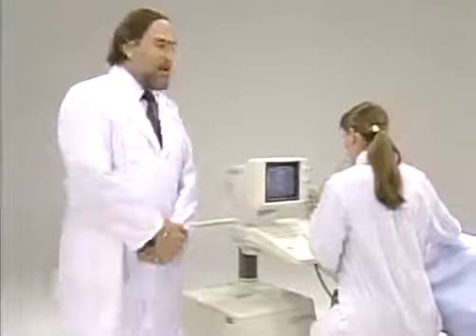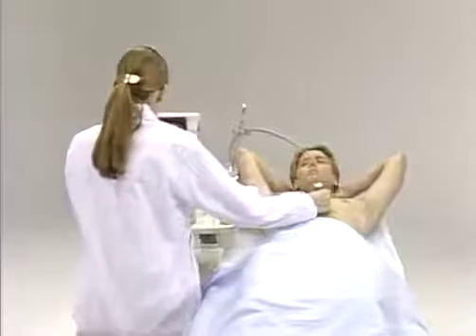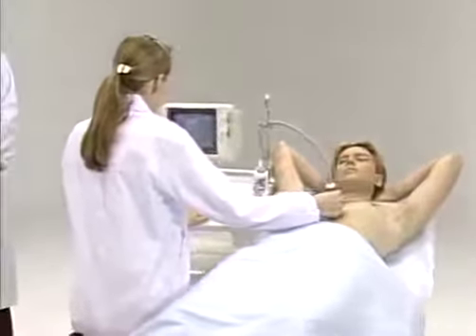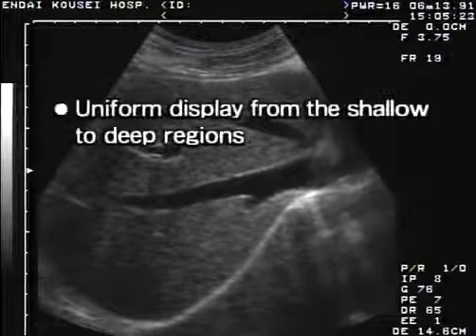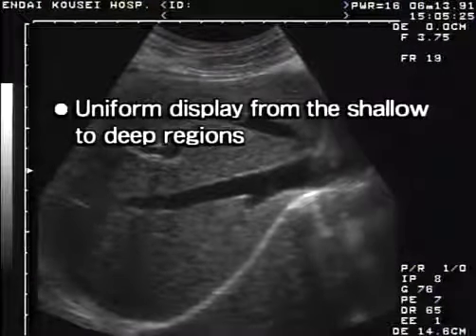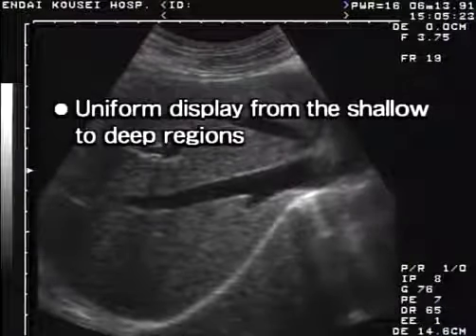Even if the various scanning procedures we have discussed so far are followed strictly, correct evaluation cannot be done unless clear images are obtained. Then, what are the conditions required for good images? First of all, echoes from the shallow to deep regions must be represented with almost the same intensity.